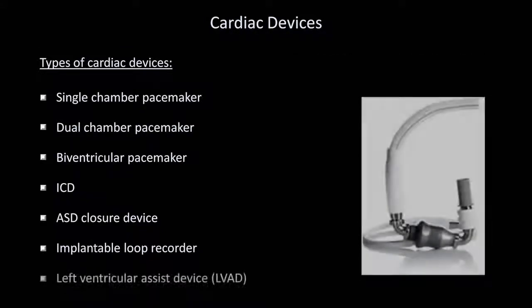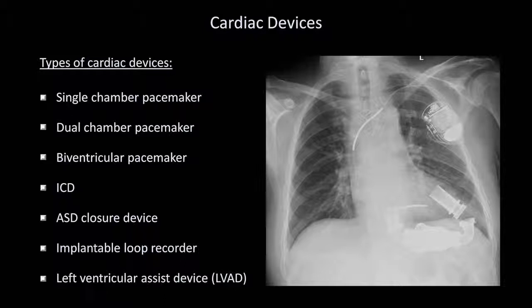And finally, what looks like plumbing equipment is actually an example of a left ventricular assist device, or LVAD, which is implanted adjacent to a failing heart, usually to buy a little time while the patient is on the waiting list for a heart transplant.